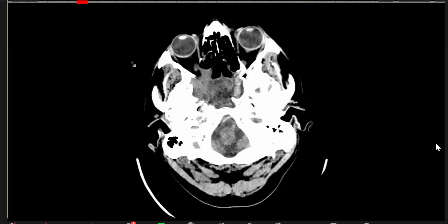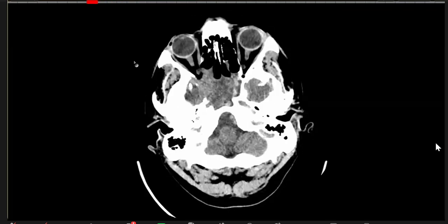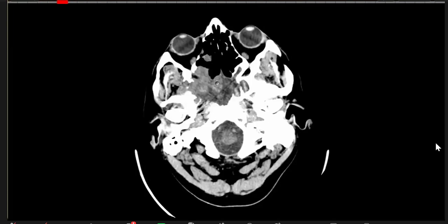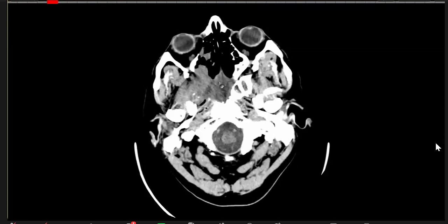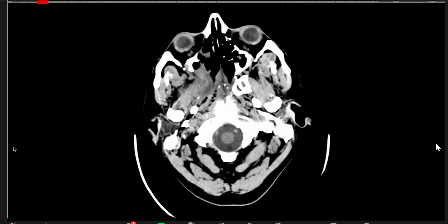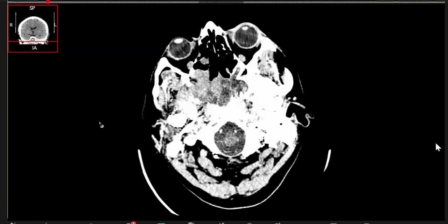Please remember that today we are in the world of base of skull, but in the exam world, you have to really make sure that you pick it up. So there is something huge happening here. The candidate did very well, asking for the bone window. Ultimately got the diagnosis also, but a bit of fine touch about anatomy, which I will point out. Now on post contrast, so this was the post contrast.